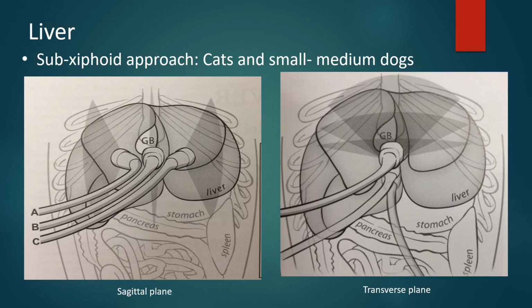our probe is oriented. So in this image on the left, we have the probe with our little notch pointing towards the head. So this would be a notch here, and you're going to fan to the left and the right. And this is kind of showing you the kind of image slices that you're going to be taking. So imagine your ultrasound probe kind of like a flashlight.